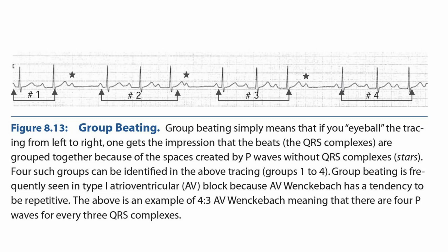Now, this is a feature you'll find in these type 1 blocks. This is known as group beating.